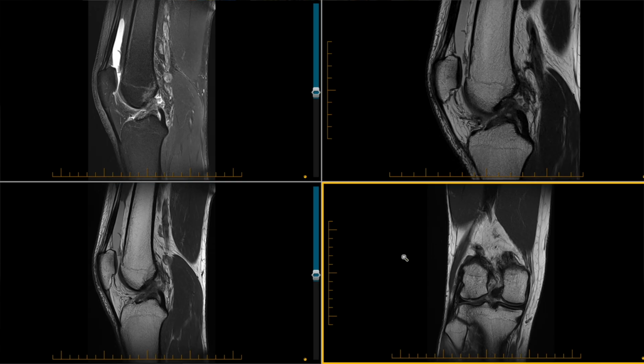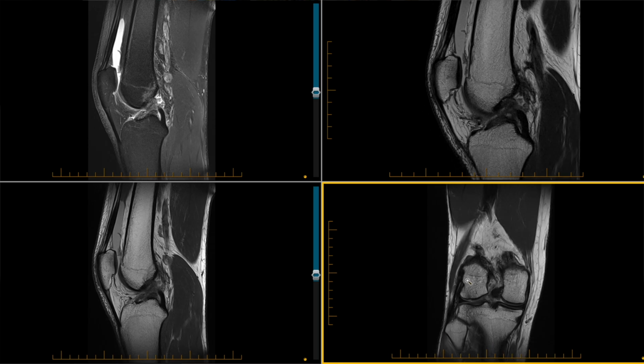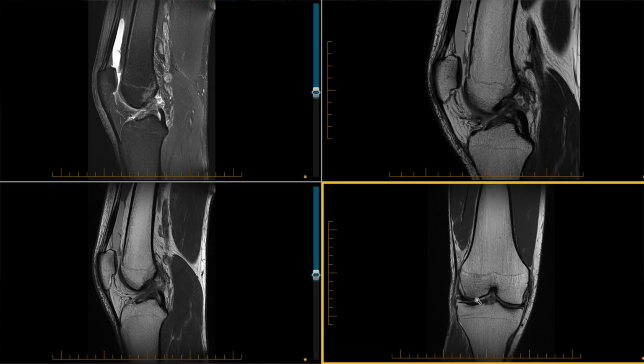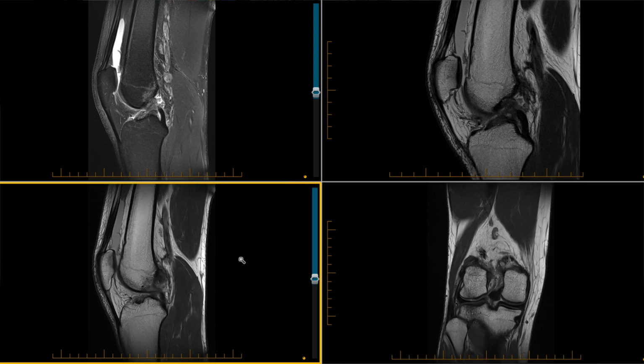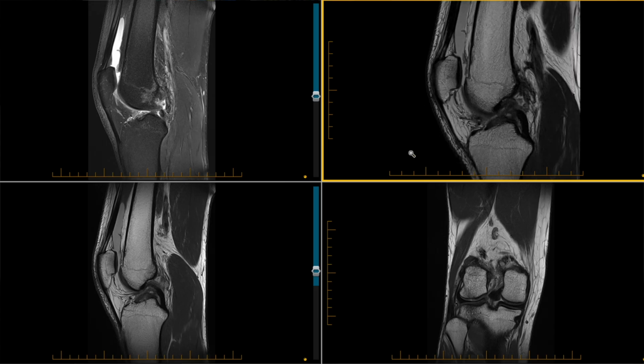There is no ACL tissue seen attaching to the femoral attachment, with the redundant detensioned ACL tissue noted within the notch, and there is no displaced ACL tissue, in this case, external to the notch, medially or laterally, deeming this to be a type 3 non-displaced ACL rupture.